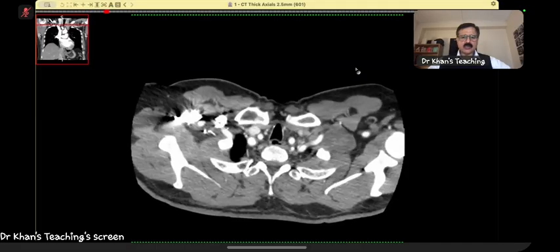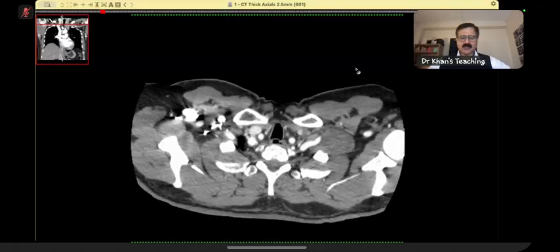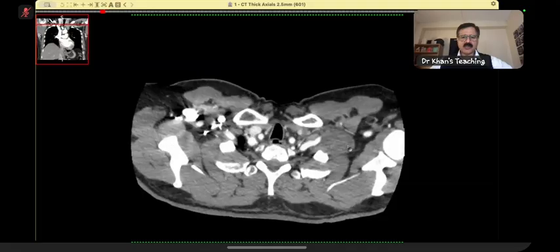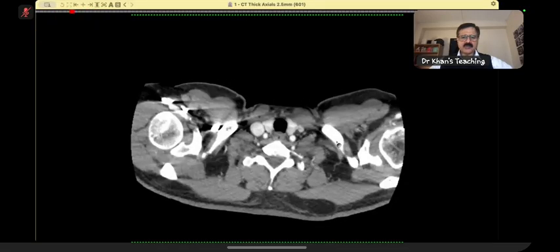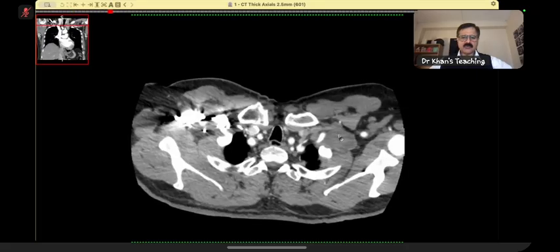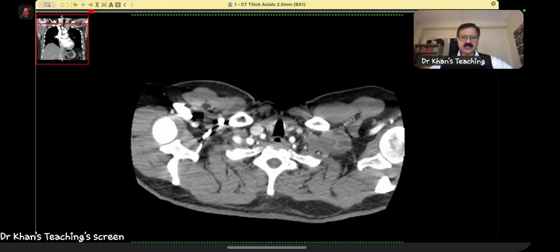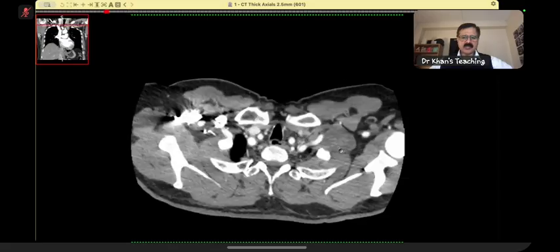Now, I also warn you how easy it is to miss this case in your day-to-day practice. And by the way, it was missed. Later on, the patient came back with some other pain, and then the MR showed it. If you see here the asymmetry, from today develop this as a key area for yourself. What I've seen is that people look for lymph nodes, thyroid, the axilla, but the eyes don't go into this area. So there is a lesion here.